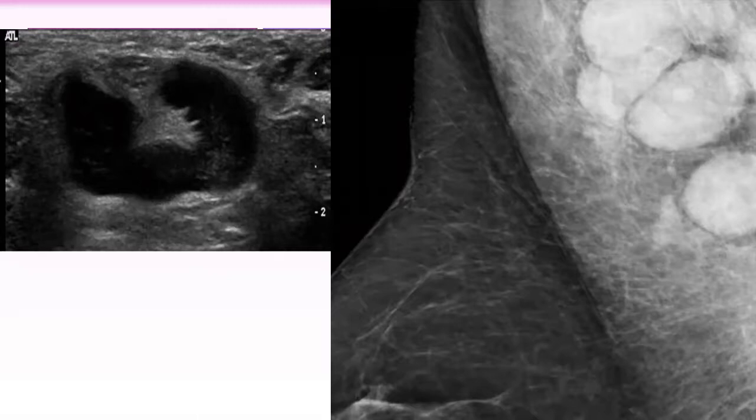But the outlines of the capsule of the lymph nodes also show the indistinct wall with some undulations and irregularity. Yes, a lobulation here. Lobulations and inhomogeneous cortex. Okay, so there is suspicion.